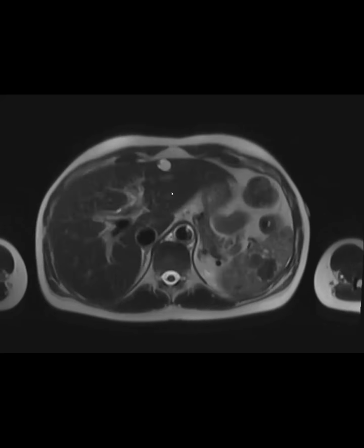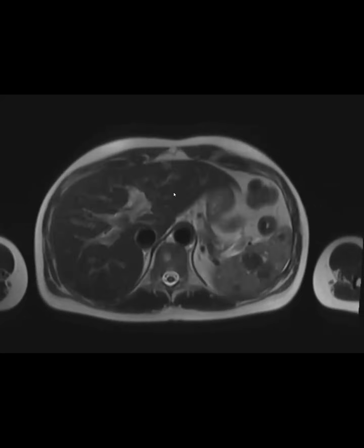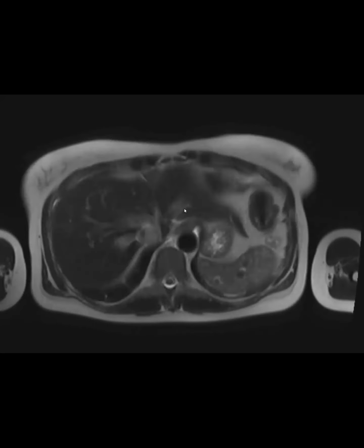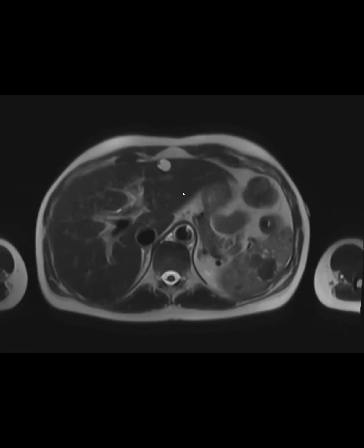Anyone? So I think this is littoral cell angioma. Aren't they supposed to be T2 bright? Yeah, I was thinking of that, but then the T2 signal kind of swayed me away. I think they're supposed to be T2 dark and have hemosiderin in them. And I'm going to show you my Radiopaedia article that says that. Not that that's full truth, but it is the crowdsource. Classic splenic lesion. Nobody agrees.